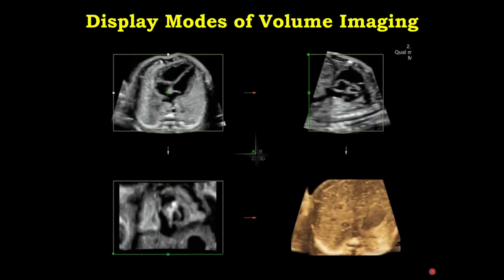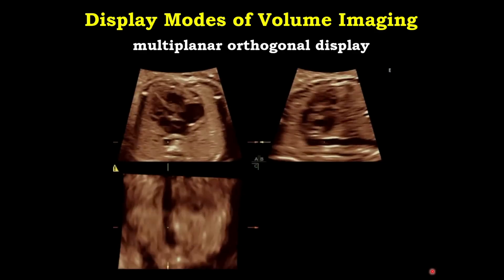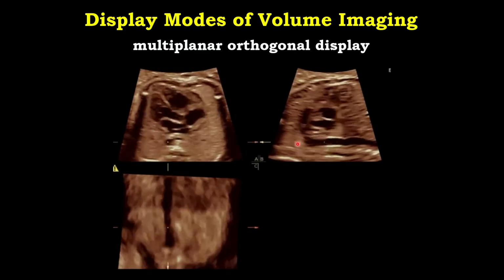The other aspect of 3D imaging, other than acquisition, which is again very easy, is the most difficult part: image optimization for 3D imaging display. And here we have, I would say, an infinite number of ways to look at that volume. The most common type of image display, which is usually how the image comes out when you just acquire the volume, is the multiplanar view, where you can look at the reference plane on plane A, and then at the two orthogonal planes on planes B and C.